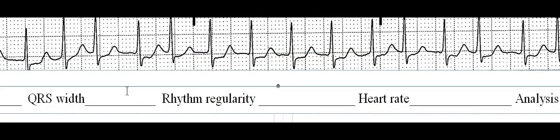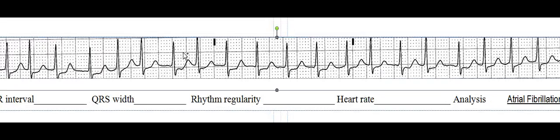Measure the QT interval by starting at the beginning of your QRS and going to the end of the T wave. And if you do that every time, you will find that the QT interval never changes. So the distance between here and the T wave is exactly the same each and every time. So that actually says it's got to be a T wave and it's not a P wave, because P waves, at least at the beginning of this course, do not go jumping around all over the place. So what you're looking at there is a T wave.